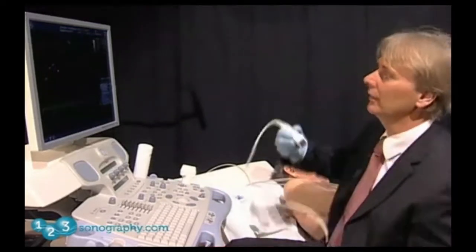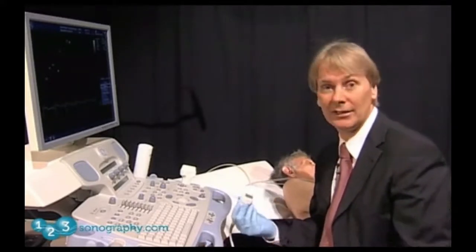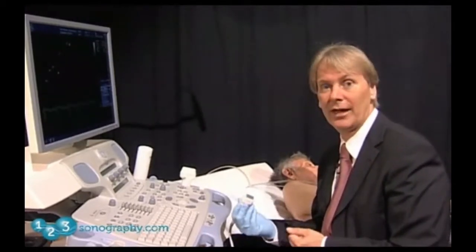Okay, so this just gives you a bit of a feeling how we go about a situation where a patient has diastolic dysfunction, and we can't use pressure half-time to quantify, and where even the mean gradient is sometimes difficult to interpret, and also planimetry is not as easy.